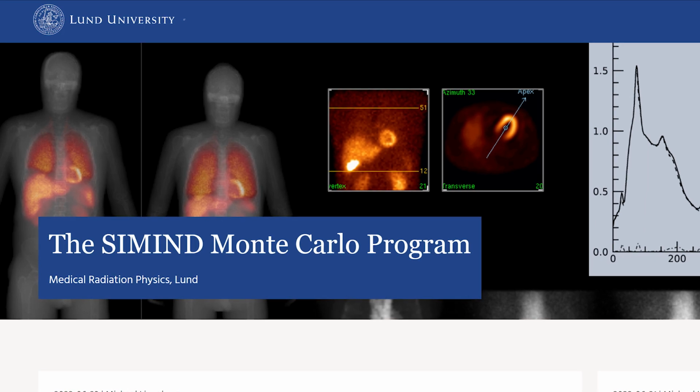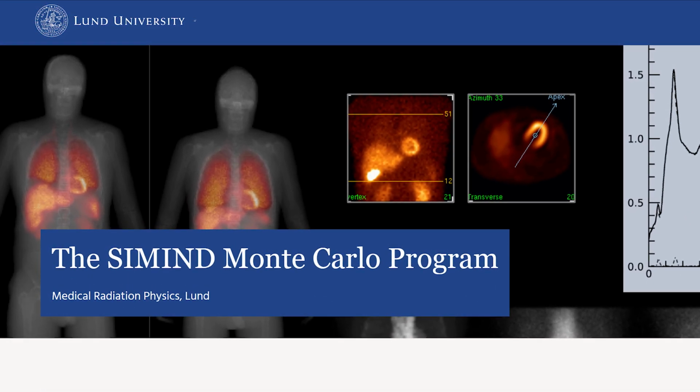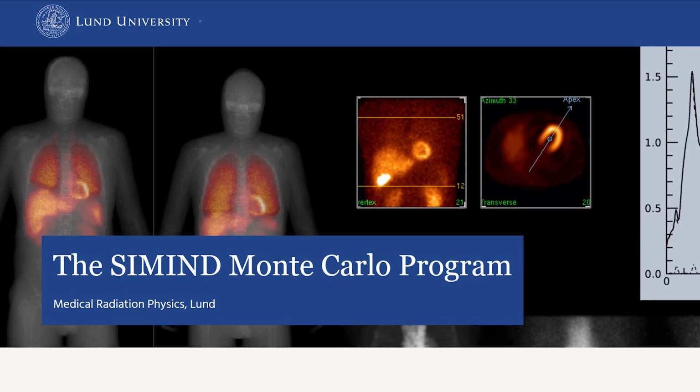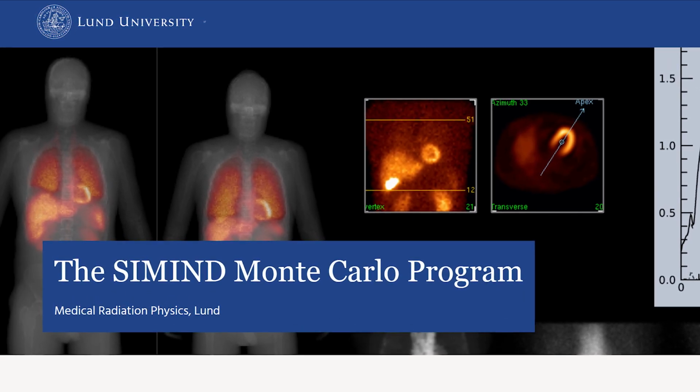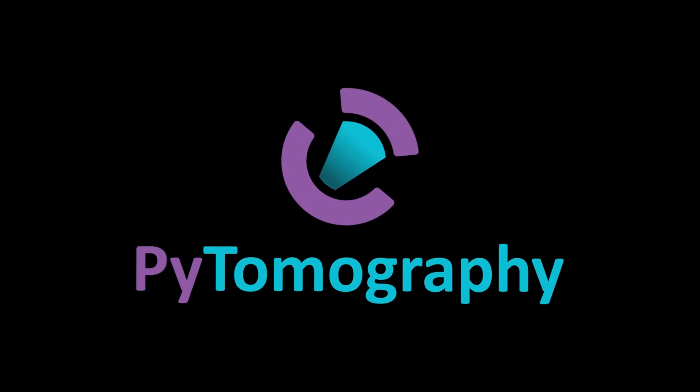Use of simulations can provide researchers essential information before conducting an actual experiment with a real-life SPECT scanner, which can be really time-consuming. In this short series of tutorial videos, I will show how to use the SIMIND Monte Carlo program to simulate SPECT. Finally, I'll show how to both open and analyze the data using the Python library PyTomography.